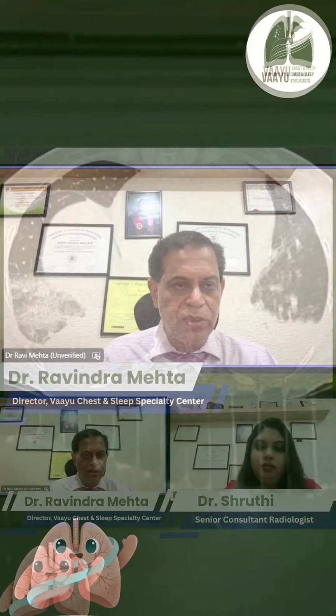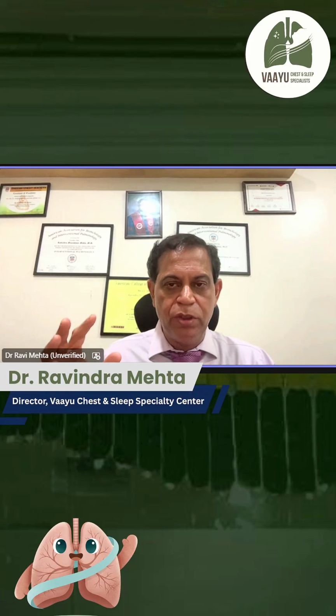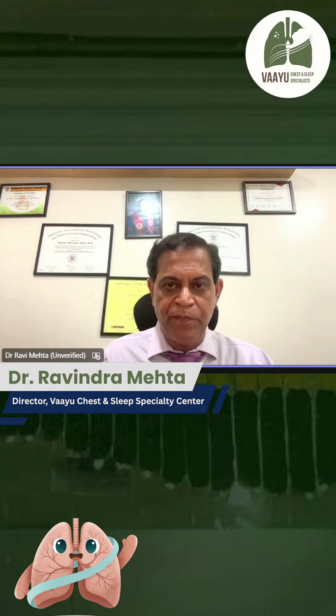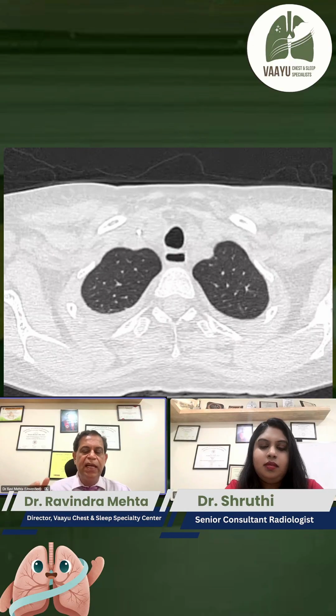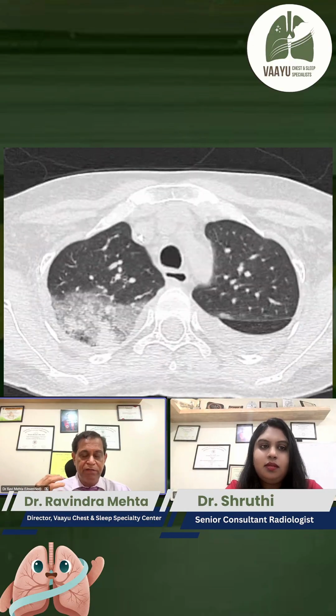So in this patient, bronchoscopy, along with not only a lavage, because the lavage will only give you so much, but also a biopsy from that area to show tissue invasion would be important. So this patient went through an expedited bronchoscopy in an interventional pulmonary suite, where both the lavage and the biopsy were suggestive of invasive fungus.